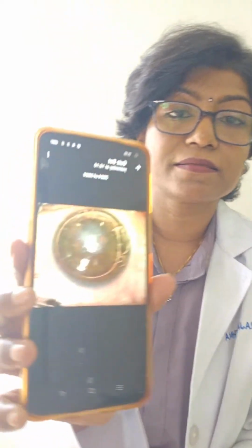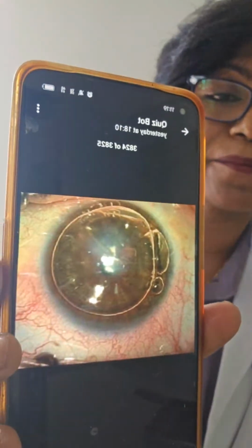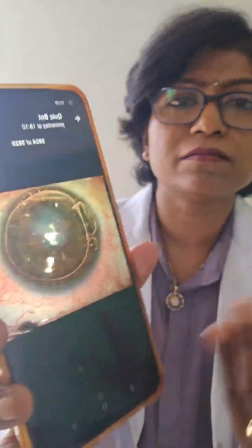Yes. So this is not penetrating keratoplasty. You definitely know this is not ICRS or intracorneal ring segments. Definitely not pneumoretinopexy. It is intracameral SF6. Yes, sulfur hexafluoride, intracameral bubble. Alright. So it could be air also. It could have been, but I have given SF6.